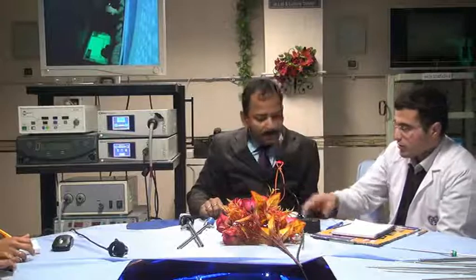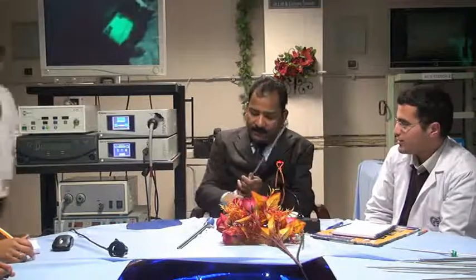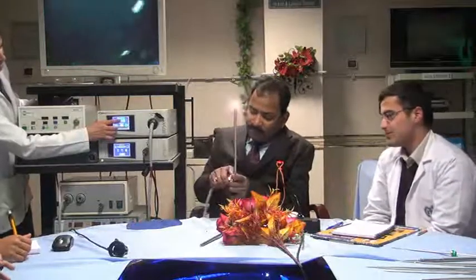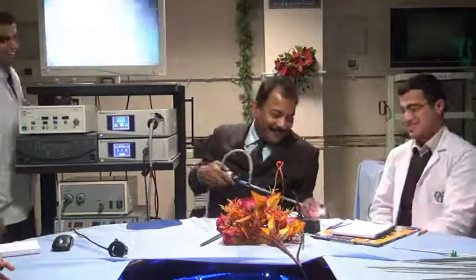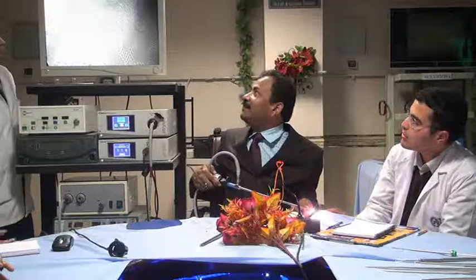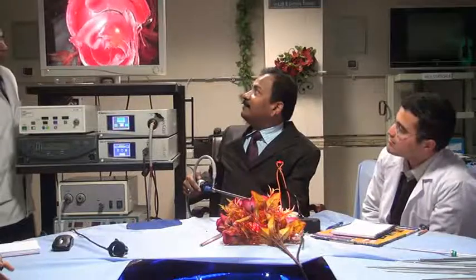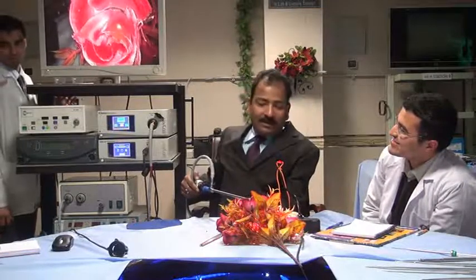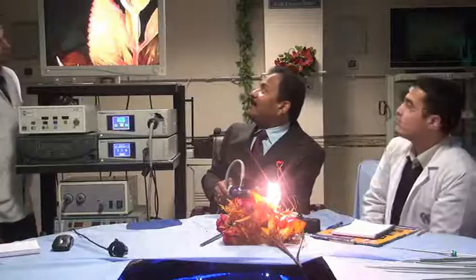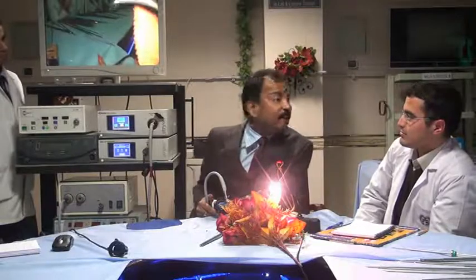Okay, Abdul. Yes, it is affected. You want to demonstrate. Yes, he doesn't believe me, so I will show you. See, I am doing white balancing on this color, right? And now, after that, I will show you this color. See, this color is not the original color which you are seeing. All the colors will be affected. How much it will be affected depends upon the proportion of any particular color.